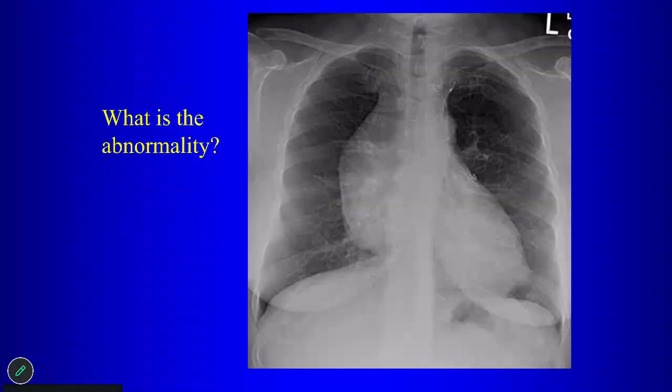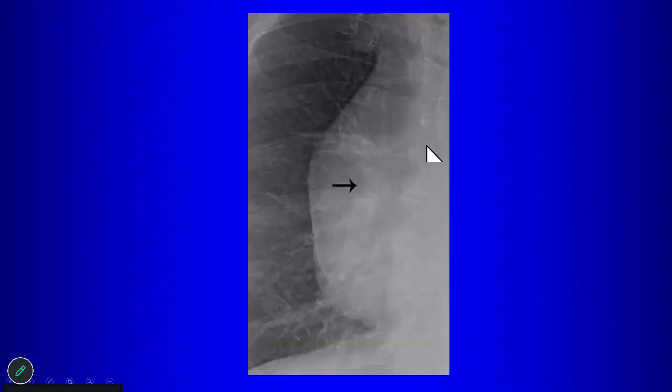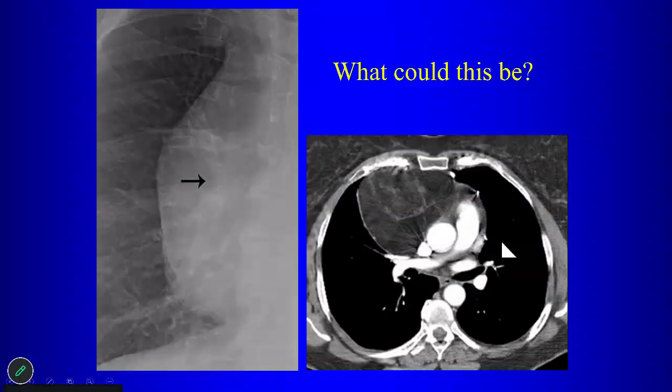It's obscuring the aorta. It's obscuring what? Oh, the right heart. It obscures the right heart border. That means it's going to be where? Anterior. Come on. Anterior, right. So we have a hilum overlay sign, obscures the right heart border. It's an anterior mediastinal mass.